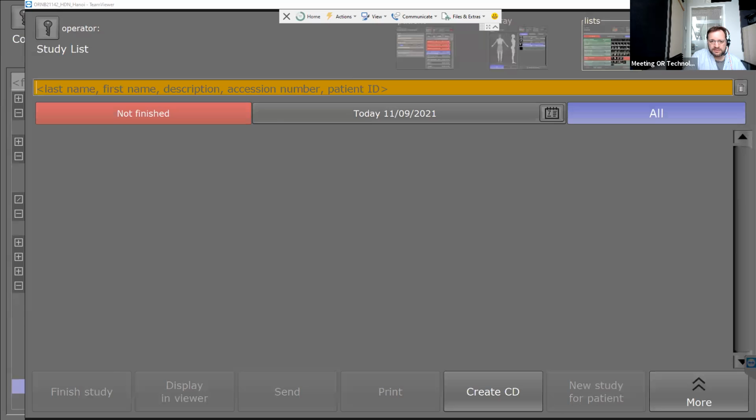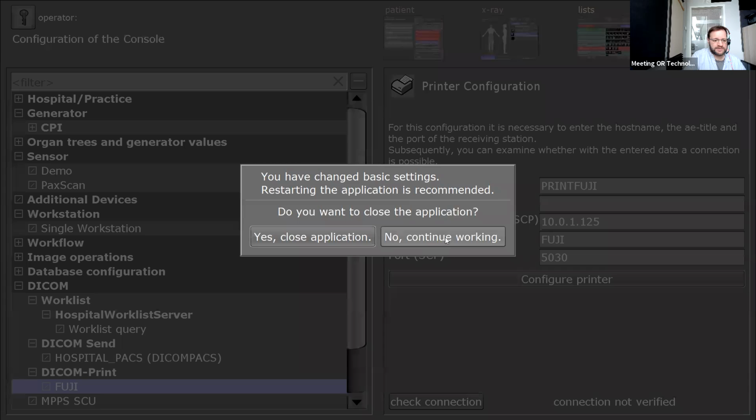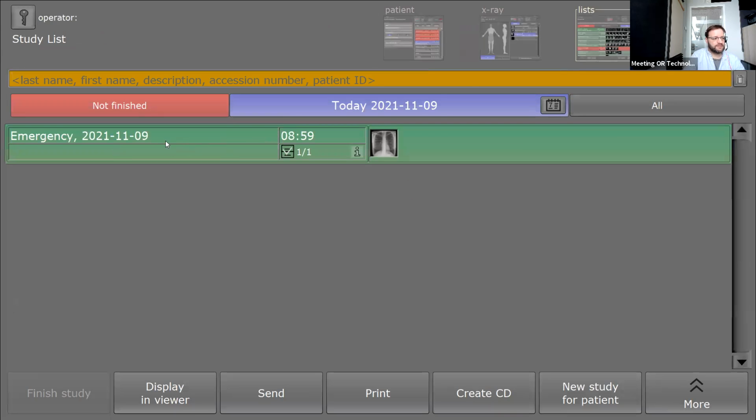I will show it here with my system. So if you have, for example, this image, and the customer claims, okay, there's a line, or I'm not satisfied with the image quality, and you don't have a connection to the internet, you need to export to something like a thumb drive, USB stick, a hard drive, or whatever. But you need to find where these images are.